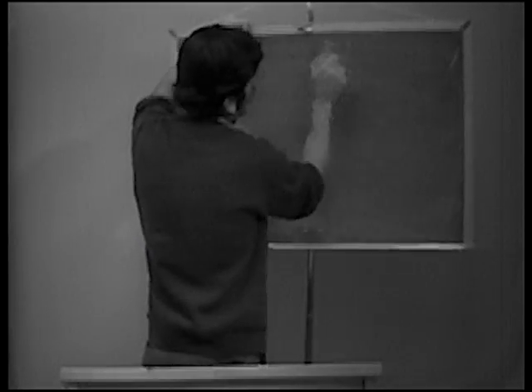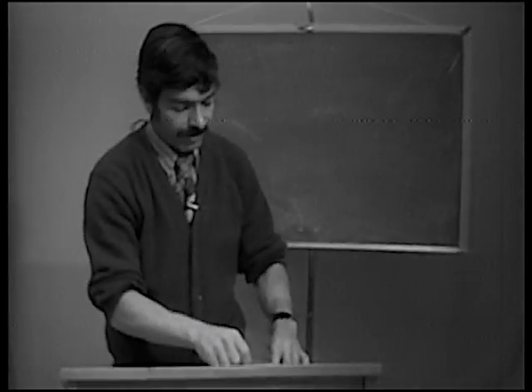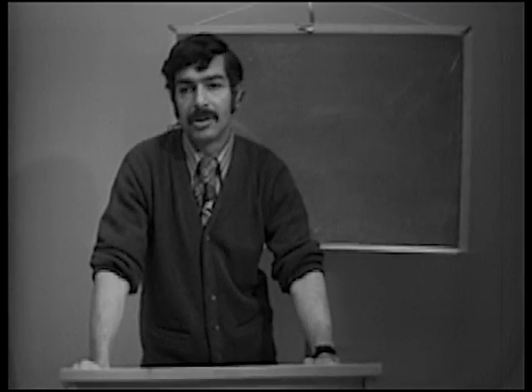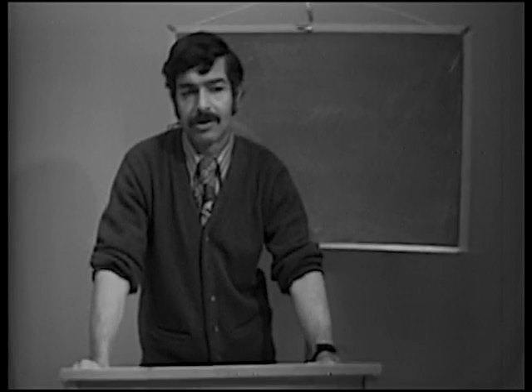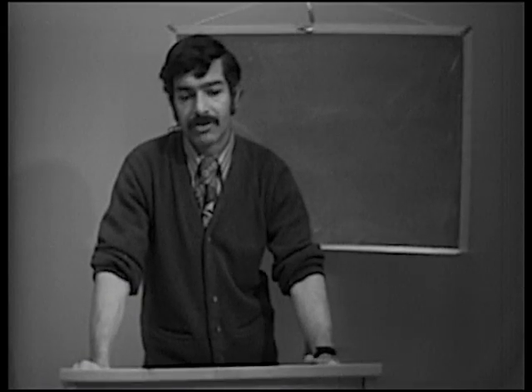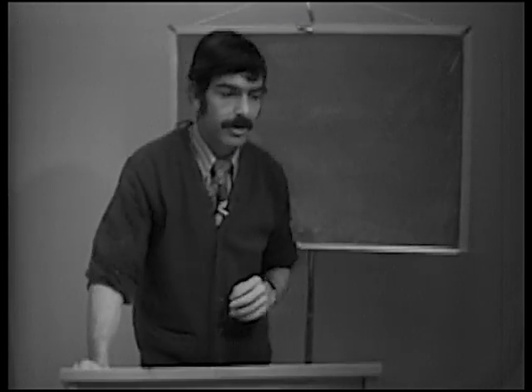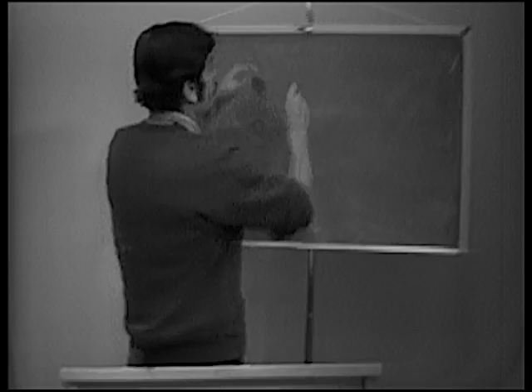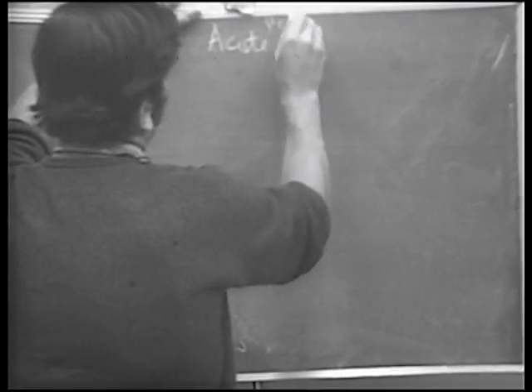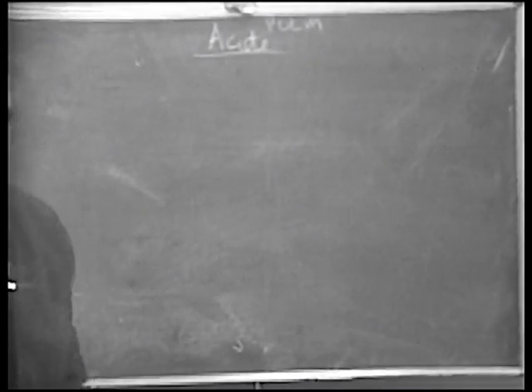Well, that finishes our discussion then of the hypertrophies, atrial hypertrophy, ventricular hypertrophy, pressure overload type, and volume overload type. Now let's continue on at this point and discuss what the effects are of pulmonary disease on the electrocardiogram. Okay, and we can break this down into acute pulmonary disease and chronic. So first let's talk about the effects of acute pulmonary disease on the electrocardiogram.